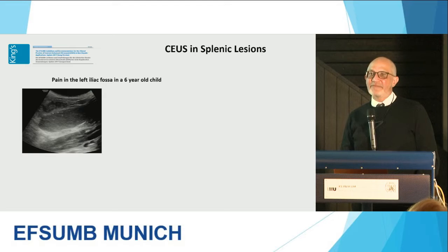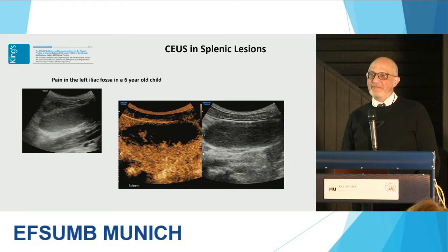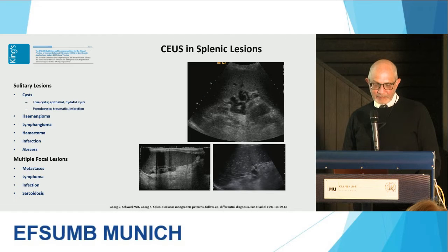This is our case. This is pain in the left iliac fossa in a 6-year-old child. There's a mass in the left iliac fossa, and when you look at it closely, it's infarcted. This is an infarcted wandering spleen. So don't think your spleen is always in one place. We've moved away from wandering spleen now, and let's look at something else.